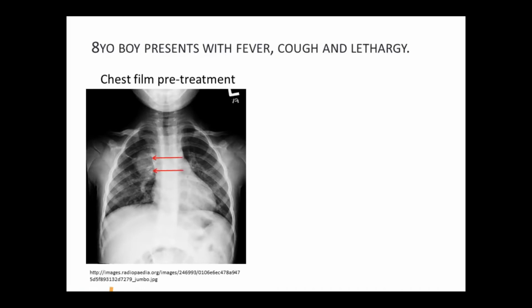Pulmonary nodules are discrete areas of opacity within the lung. Of these, the round pneumonia is the most common type of solitary lesion in the pediatric population. Our patient does indeed have a round pneumonia, but your differential for a pulmonary nodule may also include a bronchogenic cyst, a pleural fibroma, or a fungal infection.